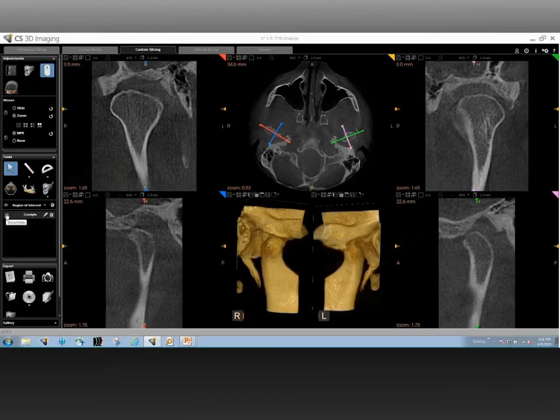With that said, let me bring this over to you, Dr. Katal, and start with a question of, could you show us the anatomical landmarks to be noted on a scan of the TMJ?